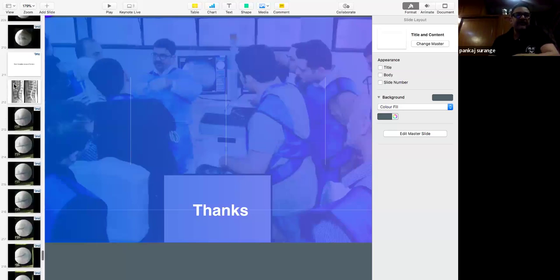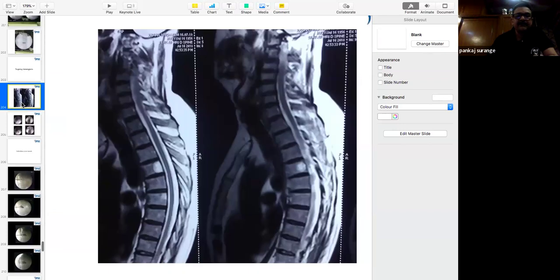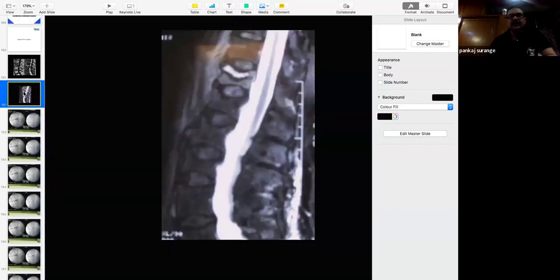Understood? Maybe I'll show you the picture. Look at this. I'll show you better. Okay. See this. Can you see this?